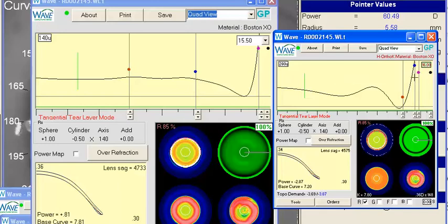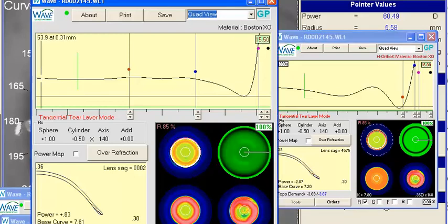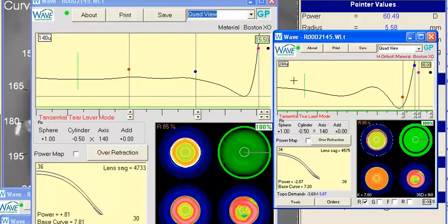We also look centrally here on your current design. You have an apical clearance of somewhere around 53.9, and this newer design gets you a little bit more at 124, right around that 100 mark. So I think this design will more likely give you a little nicer clearance over that entire graft, and hopefully give you a nice landing zone with a little flatter peripheral curve out there. So with that design, I think you do much better.